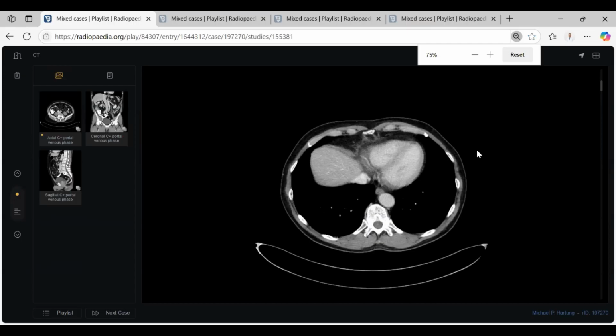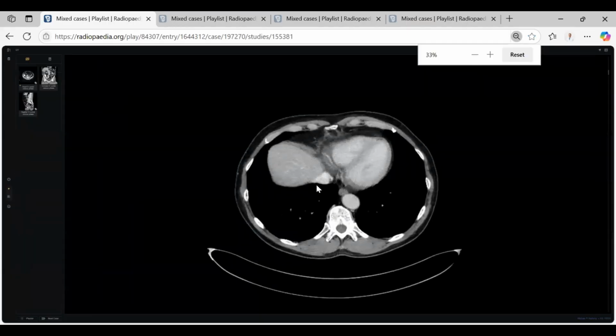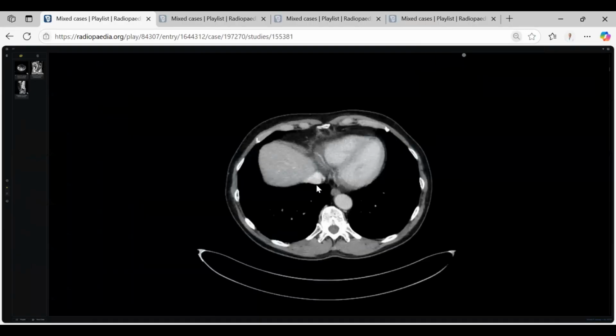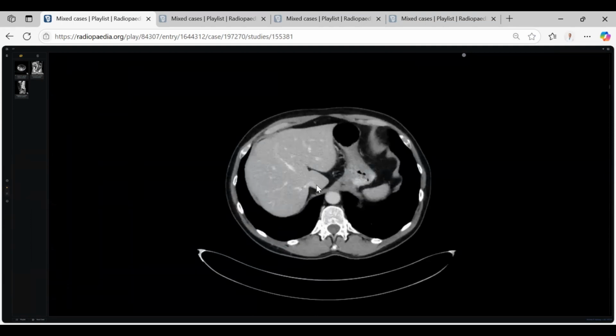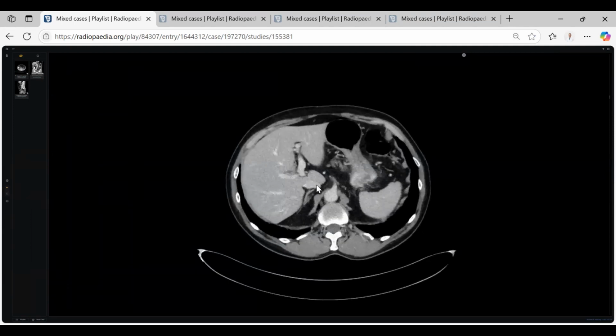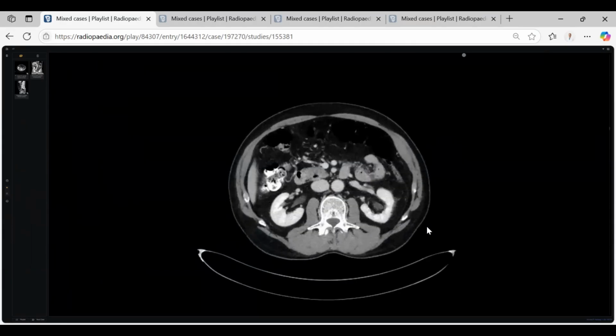55-year-old male patient with abdominal pain, weight loss, and chronic microcytic anemia. Okay. I've been presented with the post-contrast CT abdomen pelvis images of a 65-year-old patient. I'll just take a moment to look through the scan.